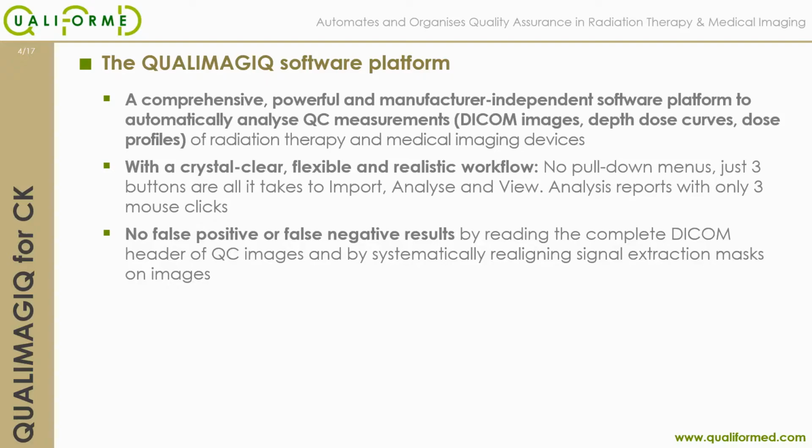Furthermore, all of the signal extraction masks are systematically realigned on the phantom in the images. So when working with phantoms, they do not have to be aligned perfectly in order for the software to analyze them correctly. Some competitors hide this crucial point. Their solution automates the analysis, but you lose a lot of time to realign the phantom perfectly on the imager.